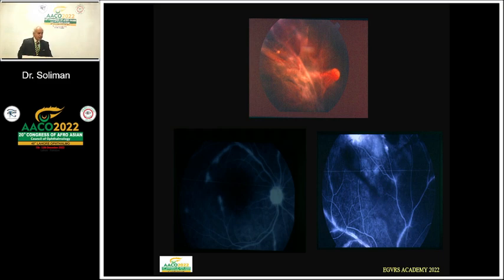She presented with, as you can see, a PVR form, an aggressive form of proliferation, and a lost eye, the upper one there. But this eye was 6/6 vision, and we did the fluorescein for her, and as you can see, a very significant periphlebitis. She was not previously diagnosed as tuberculosis.